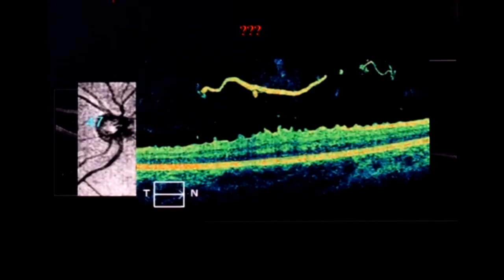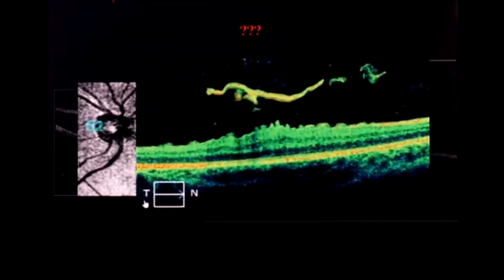If you go above and below, you sometimes may be able to see a place where the retina is infolded here, and the adjacent layers have been brought closer together. So this may appear continuous. Just above or below the scan, they may appear continuous and may appear as ectopic. So on magnification, you can make it out very clearly. Again, this is a small video that demonstrates the same. So I have paused it.